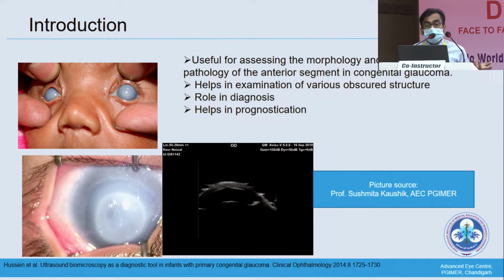As the previous speaker already told, it helps in examination of the anterior segment in an obscured cornea or any structure behind the iris. It has a role in diagnosis in challenging cases and helps in the prognosis of the cases also.